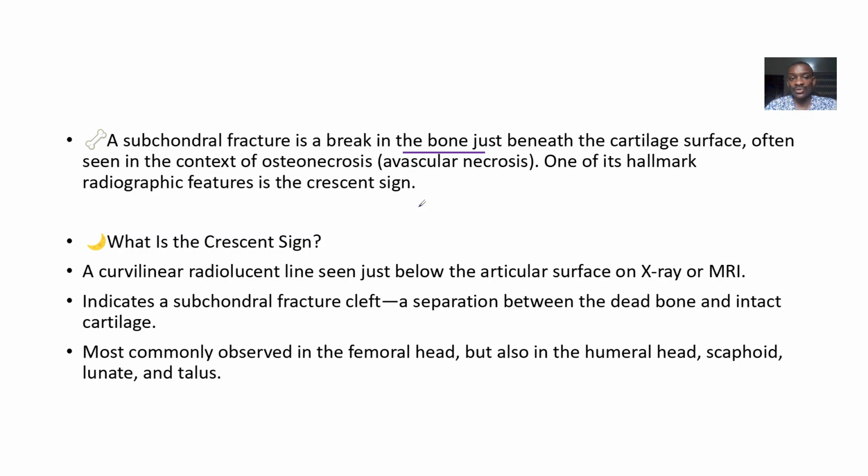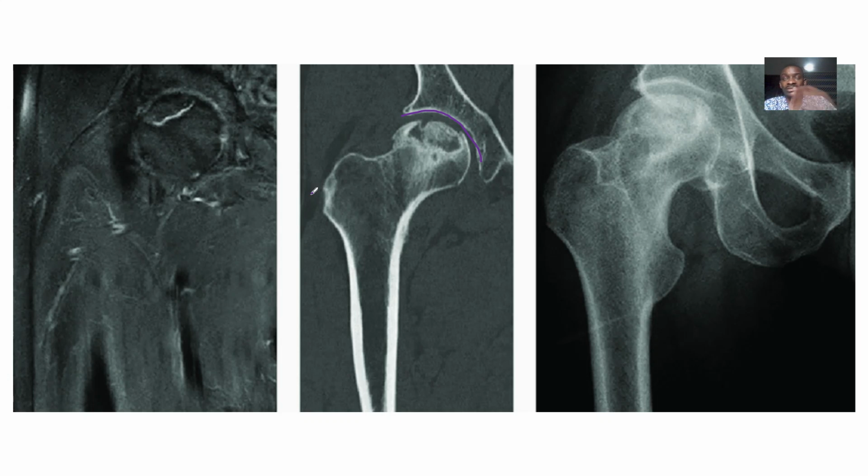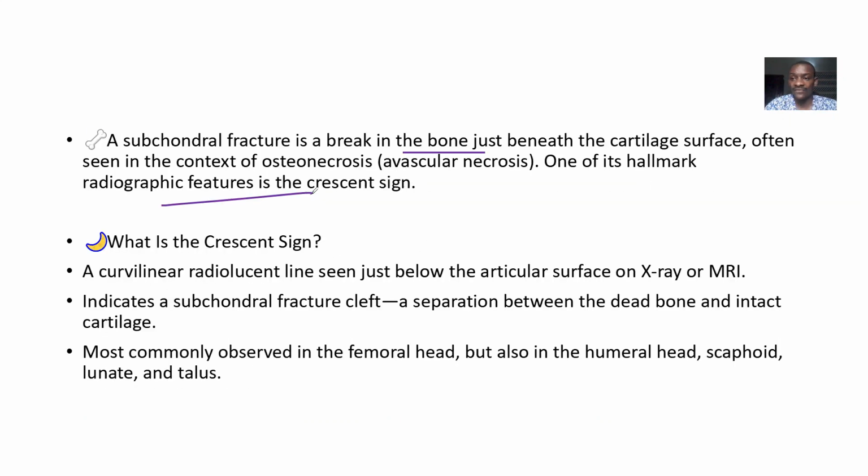So it is actually one of the hallmark radiographic features, this crescent sign that we're looking at. Once you see it, it establishes that a fracture exists. So what is a crescent sign?